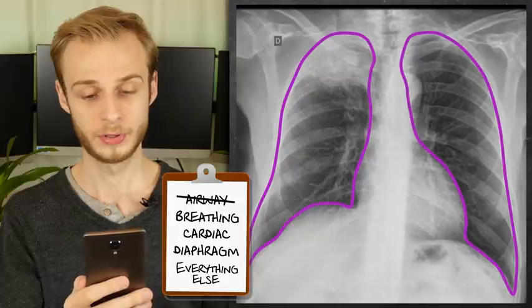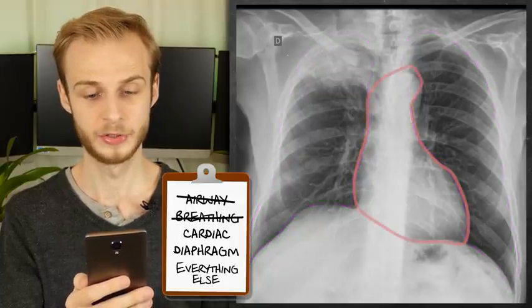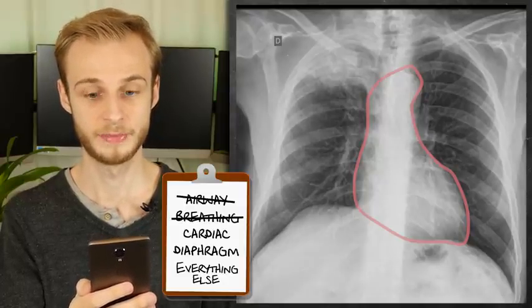The pleura look normal. There is no evidence of thickening. The cardiac shadow is well defined and of a normal size. I can visualize the arch of the aorta very easily. The left ventricle and the right atrium are visible as well.